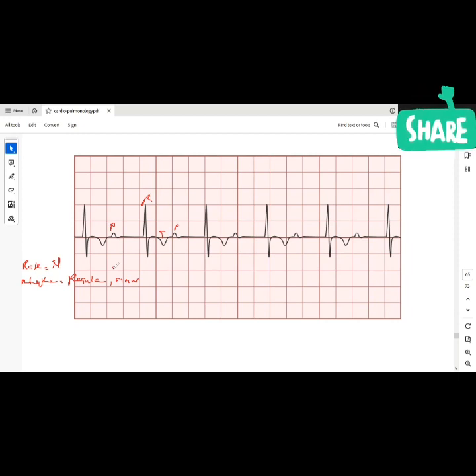We check, make sure the P wave is above the T wave. What do you check there? Be systematic so you don't miss anything. What would be the best way? Good. So you start with your P, correct? Very good. Now, tell me about the P. Is the P abnormal in shape, size, height, whatever? P is normal in shape. Good.